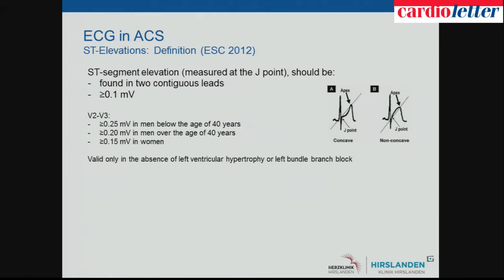That's why the actual criterion we use is ST segment elevation in 2 contiguous leads with a typical aspect of more than 0.1 millivolts, and the criteria are refined for V2 to V3 with other thresholds. Here, it is a bit more complicated in men than in women. And these criteria are valid only in the absence of left ventricular hypertrophy or left bundle branch block.